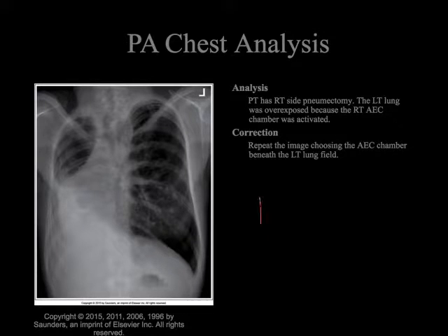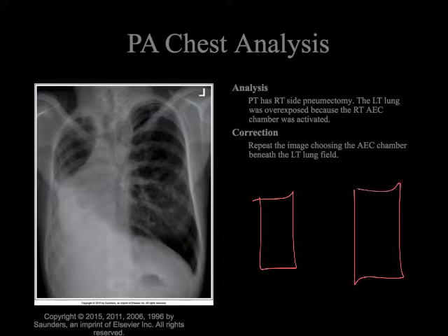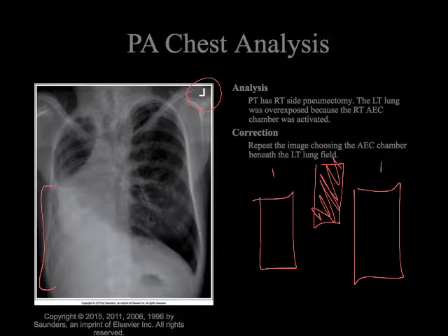What are they talking about? We've got AEC chambers, right, inside our board. A lot of times there's a display that looks something like this at the console. The technologists, when they set up this patient for exposure, you notice the marker backwards, they activated these lateral AEC chambers, right? So it didn't cut off the exposure because it had not yet fully penetrated this area of soft tissue inside of the patient's right thoracic cavity. And you'll notice there's a lot more density here than there is over here, right? So it burned out down here because of that.